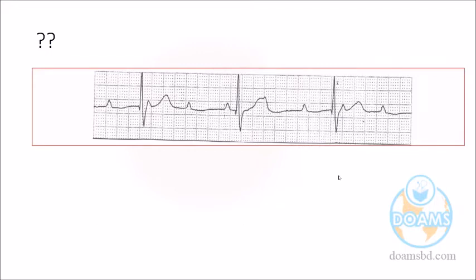Anyone? Ankit, please annotate. This is the P, this is the P, here is the P. No, sir, I did it. Oh, fantastic, you did it. Thank you. Don't give more marking here. Right, yes. In between, so this is the P. If it is the P, then this is not maintained, doctor. One is longer, one is smaller. So in between there is another P. Yes. Which one could it be?